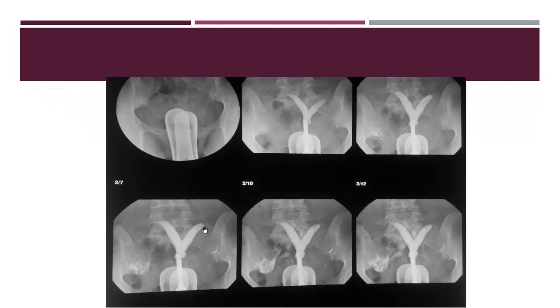Another case, duplicated uterine cavity. I think this case is secondary infertility, because we see here the site of the cesarean section, the wedge-shaped defect. So this is a duplicated cavity. From here I can say it is septate because there is intravasation in the myometrium in that part.